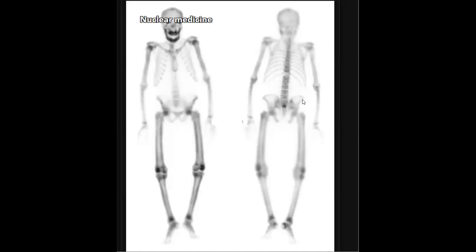They have metabolic and they have metastatic. Which one fits this case? Do you think this goes more with the metabolic or metastatic? And what is your evidence? Yes, your evidence is the mandible. Excellent. So when you find there is uptake in the mandible, you think more that it is a metabolic super scan.